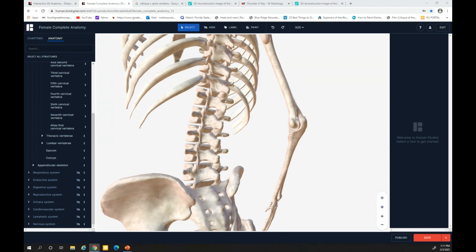So this patient is in RAO position. We have to remember what patient's side we're seeing here. The left ribs and left ilium are elongated, and the right arm is down towards the bucky.